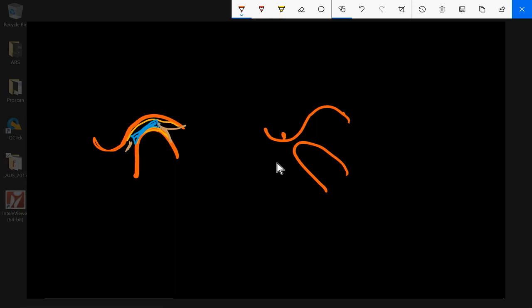Okay, now we have our meniscus. What's happening to our friend the meniscus? Our friend the meniscus that was initially at about 12 o'clock, so we'll make a little clock face right here. There's the center of our clock, and that would be 9 o'clock, that would be 3 o'clock, this would be 12 o'clock. Our meniscus, and by the way, this little center of the clock is right between the back and the front of the cortex. The top to bottom position of the clock really doesn't matter. But I have it usually equidistant. Whatever this distance is, that's how far down I drop my line.